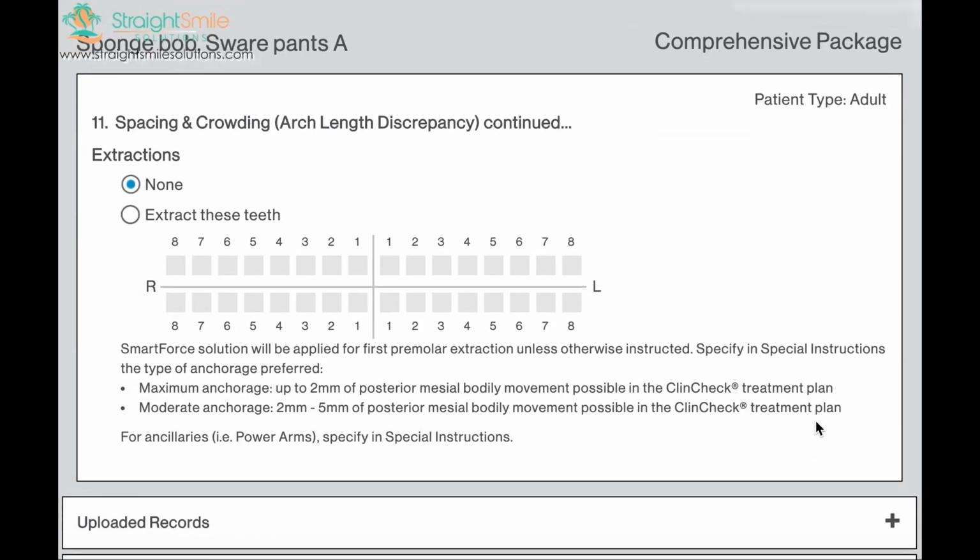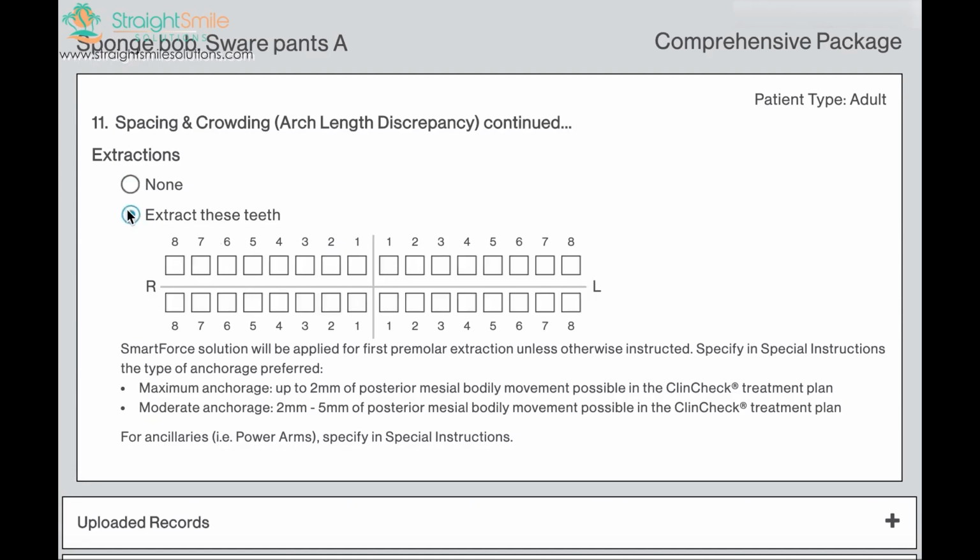Extractions. Obviously, again, I can't repeat it enough: if the patient has third molars, you need to capture them. If they're erupted, they have to be captured. Either way, I would not capture them or pull them if they're not beneficial to the patient. It's real hard to do that in an impression tray, so that's just a benefit of a scanner. If you're planning to have them extracted before delivery, you can go ahead and mark them off here. Extract these teeth, just go boop, boop, boop, boop.